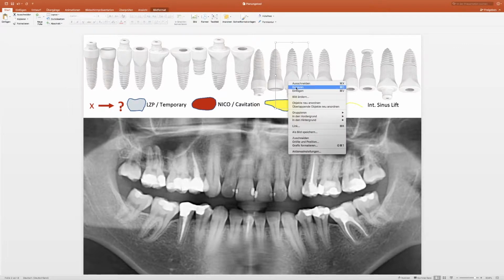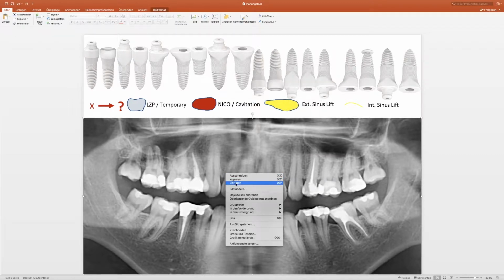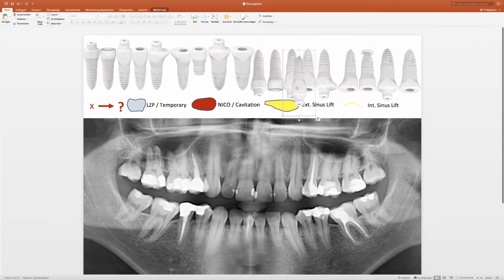The advantage is that I have a more stable implant and I can put it in the middle of the double alveole of the upper tooth number 4. So the advantage of the 4.6 implant is that the tulip width is also 6 millimeters transversely, but mesiodistally it is reduced to 4.6, so we have an oval shape. And here once again it is turned by 90 degrees so that you see the shape.